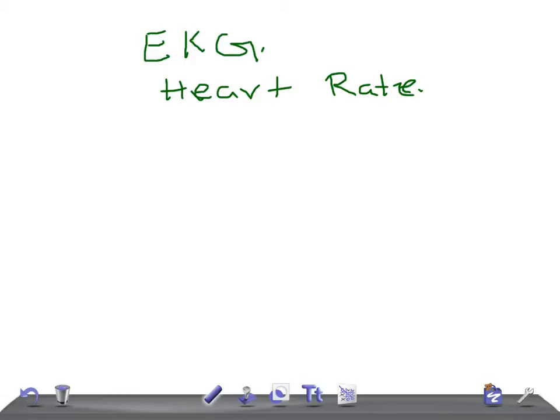counting it. There's one simple method by which you can calculate the heart rate, and that is going to be a standard, right, guys? You know very well the heart rate is really very important. We have two types: bradycardia or tachycardia. If it's less than 60, it's going to be brady. If it's more than 100, it's going to be tachycardia, right?